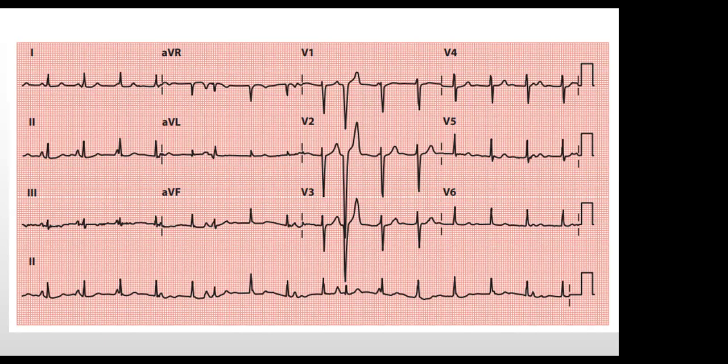Yeah. But again, can you say this is tachycardia? Is it more than 100 if you look at the rhythm? Okay, it's just around 100. So one feature here is that you're having P waves of different sizes and different morphology. So it tells you that it's coming from different foci, which is in keeping with multifocal.